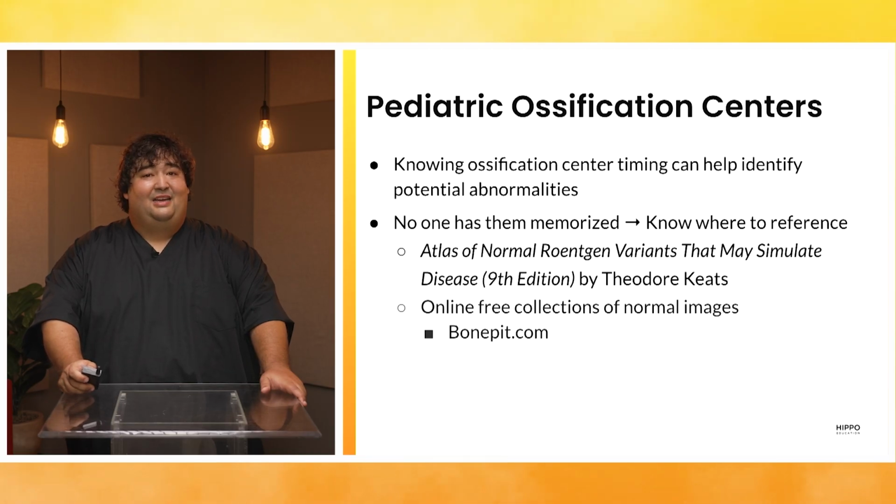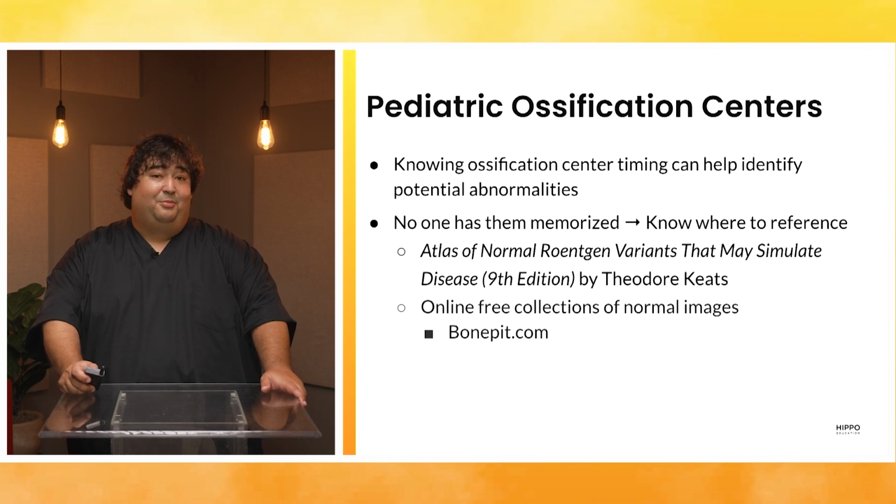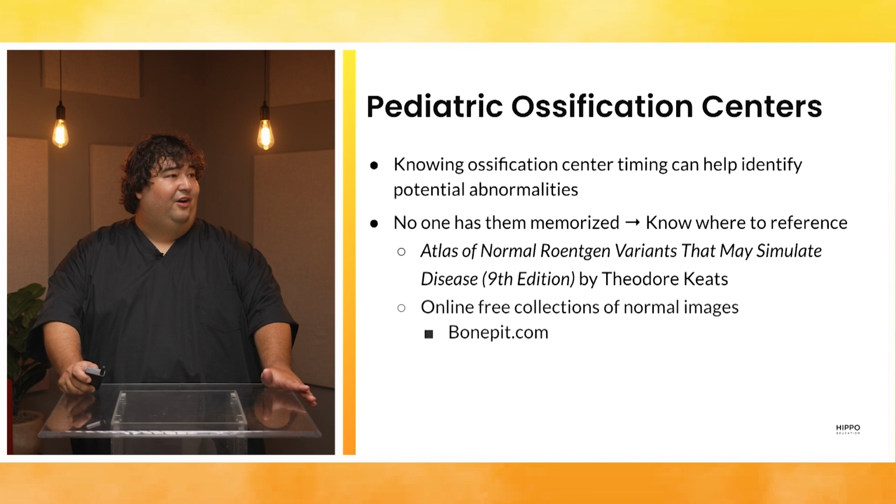So getting an idea of what these ossification centers are and understanding where they exist is really helpful in understanding what's a fracture and what's not a fracture. Even as a pediatric radiologist, I don't know every single ossification center, but it's important to have good references that help you identify where these are and what normal bones look like at certain points.